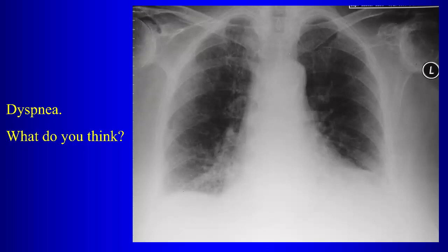It's like right lower lung and peripheral bilateral increased interstitial. Yeah, after 50 cases of interstitial lung disease, I'd assume at this point you would talk about reticular opacities in the lower lung distribution. Right? Okay, so we've gone through a whole differential of what this could be. Now you, in your borderline clairvoyant fashion, tell me exactly what this is and why.